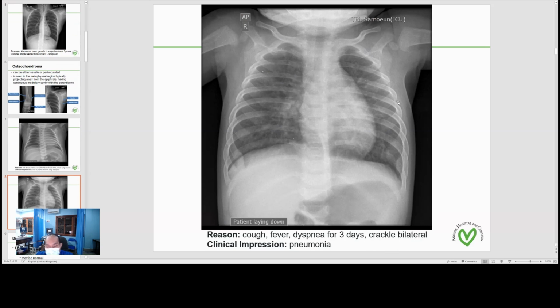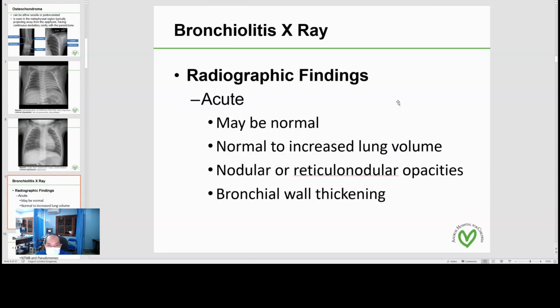So the problem is we see the lung markings increase, increased lung volume and flattened diaphragm, and peribronchial cuffing, and there is no definite consolidation in both lungs, and heart is normal size. So this is more likely a case of bronchiolitis. So what can we find in the X-ray to confirm acute bronchiolitis?